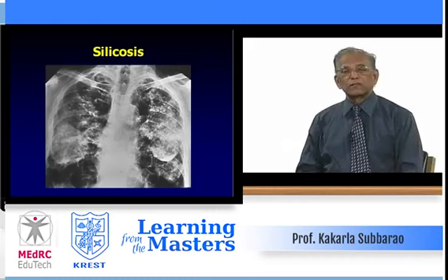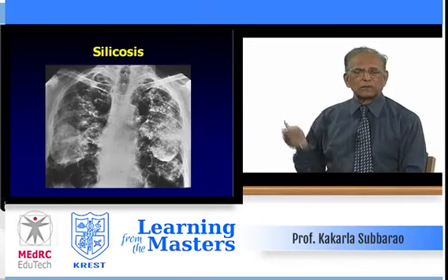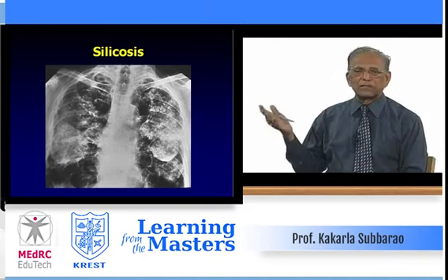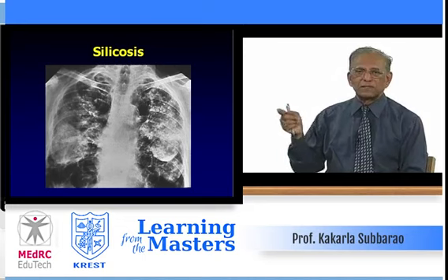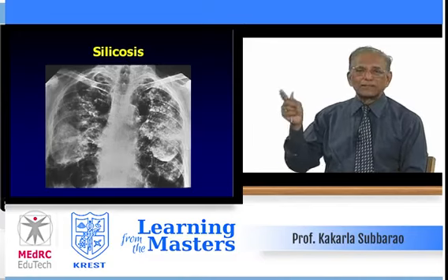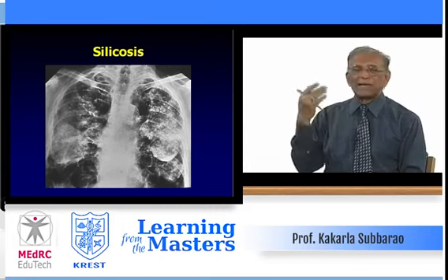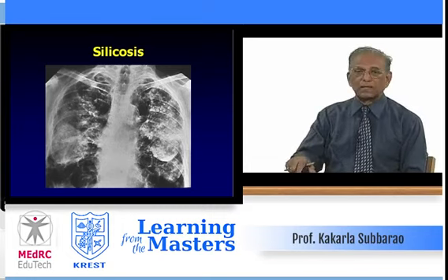And then occupational disorders. Still, manually, our granite workers are exposed to silicosis and pneumoconiosis, etc. In silicosis, classically bilateral patchy densities. Note the lateral margin of these densities, fibrosis, lateral margins are parallel to the thoracic cage. That is classical of silicosis, apart from calcifications and eggshell calcifications in the mediastinal and hilar nodes.